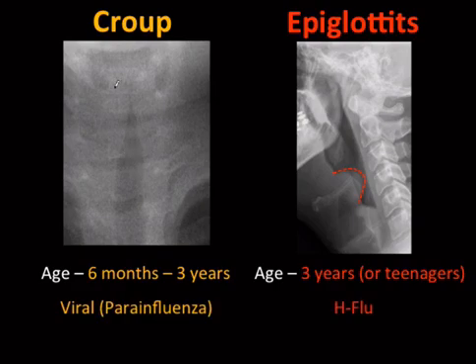So this is something else, just for real-life purposes, is that you don't diagnose croup on x-rays. People try to do that. Sometimes it's silly. The reason that they even got the x-ray was to look for this, epiglottitis. That's what they want to know, because if you go messing around in somebody's mouth when they've got epiglottitis, you can lose the airway. Croup is a clinical diagnosis. It's common. It's in this age group. You know, they got a barky cough and all that stuff. And it's not like, no steeple sign, not croup. That just happens to be something that's seen sometimes. The purpose of the x-ray is to look for other stuff other than croup.